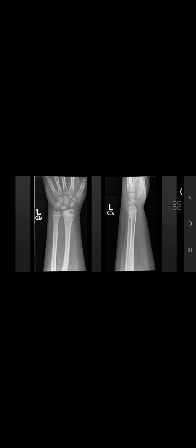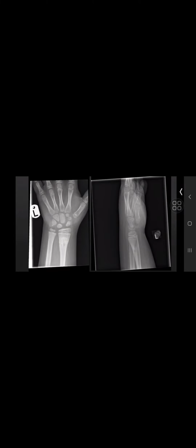Sometimes you can get these post-fracture healed, like this 10-year-old male that came in who had this fracture, and then it got healed. And while it was healing, this lucency developed, and then that persisted for a few days. But his bloods were not very abnormal, and we just followed it up over time, and it healed eventually. So that was just a lucency at the fracture site.